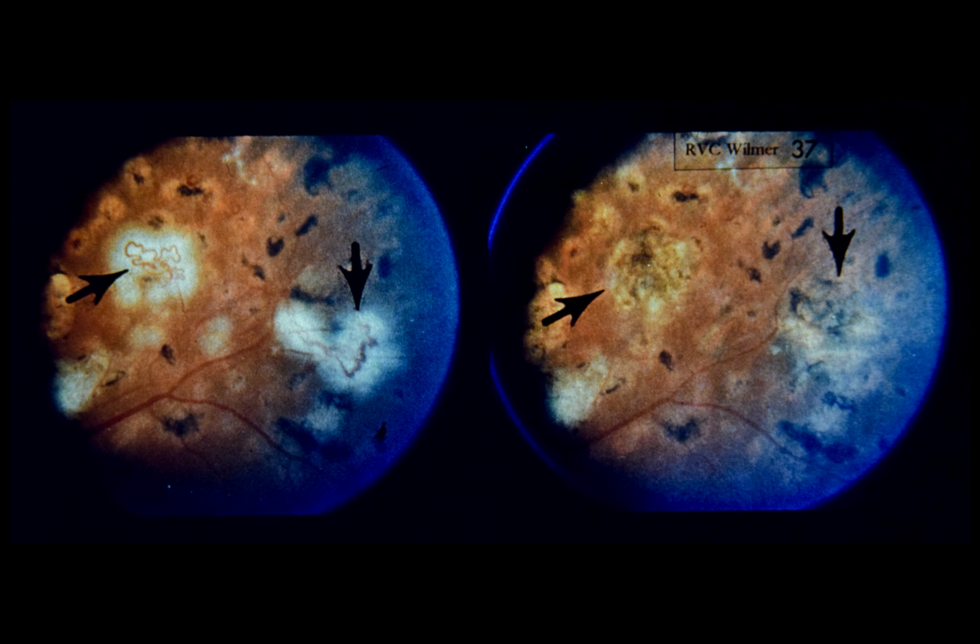On the other hand, when utilizing the xenon arc modality, one often does not achieve fragmentation at the time of treatment. However, because the intensity of the xenon arc burn is considerably greater than that of the argon laser burn, it is customary to observe complete closure of retinal neovascularization 3 to 6 weeks following xenon arc photocoagulation treatment.